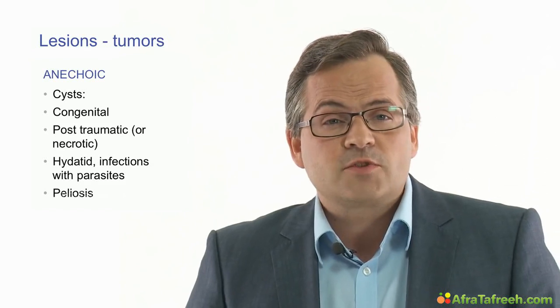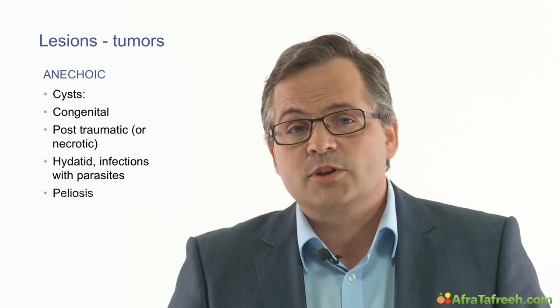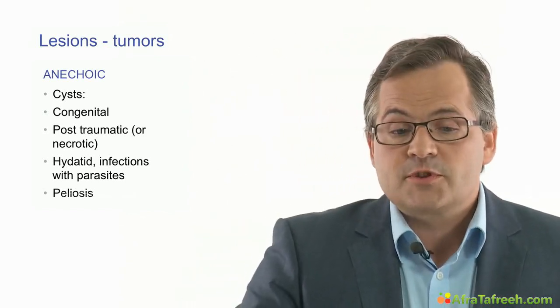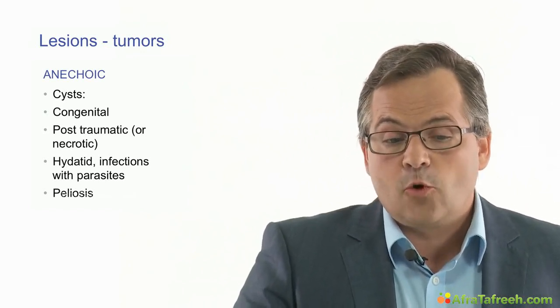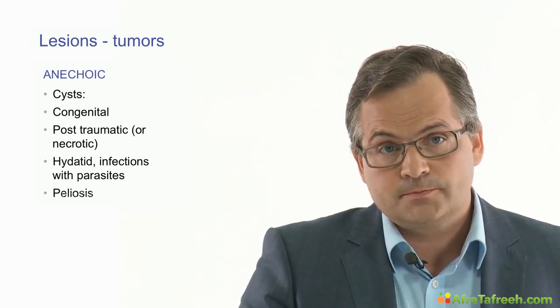If an infection with parasites, such as echinococci, has been excluded, a cyst of the spleen usually needs no further investigation. Other hypoechoic lesions of the spleen can include bleeding and cysts, infarction, granuloma, or in some cases a malignant lesion such as lymphoma.